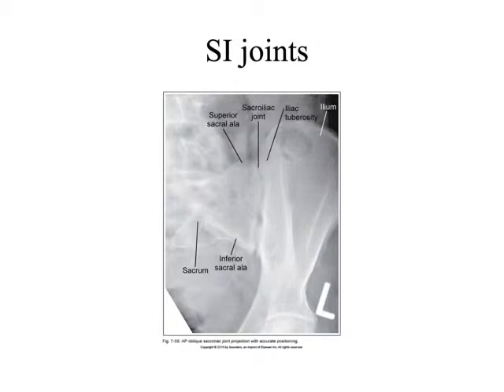Now, I know that seems incredibly childish in a way, but it's also really helpful to be able to articulate what we're seeing. If we're in the middle of a surgery and we're trying to visualize something on an image, and we need to ask the doctor what they're looking for, we need to be able to articulate what it is they want to see on the image so that we can address that.